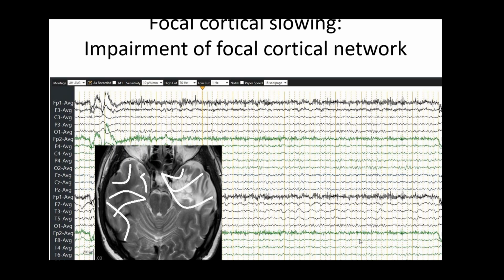And we know it's awake, the predominant pattern is low voltage beta anteriorly. All right. You look in the temporal cortex, on the right side is low voltage beta activity. But when you look on the left, you see predominantly delta. All right. And what happens is this cortex that is damaged loses the ability to activate cortical networks to create the fast activity consistently.